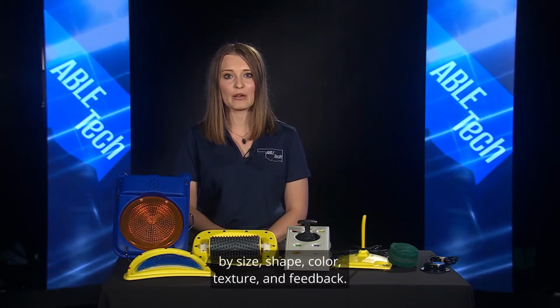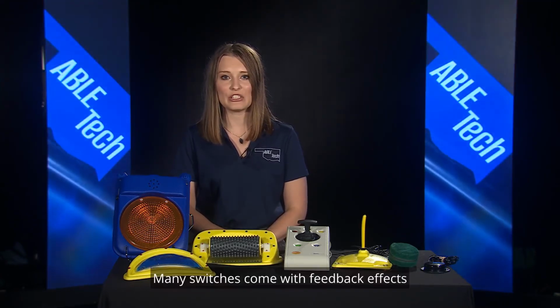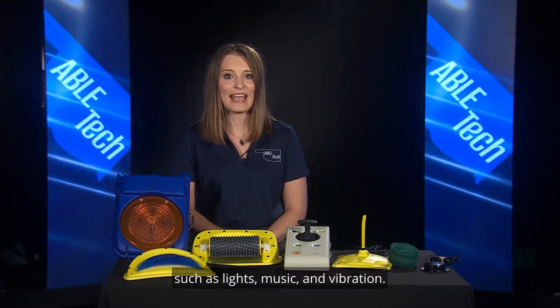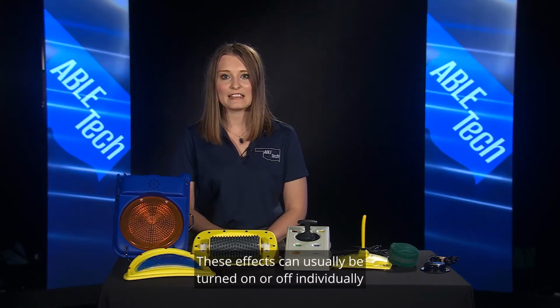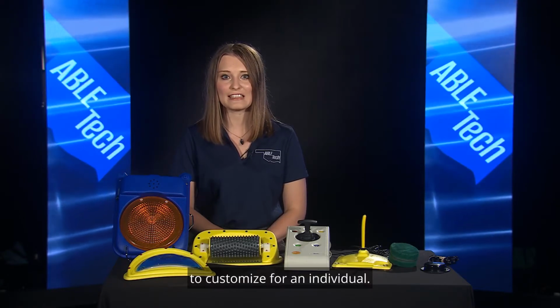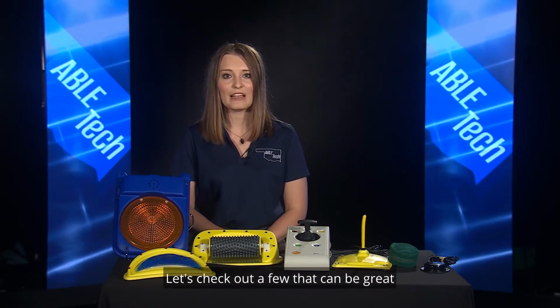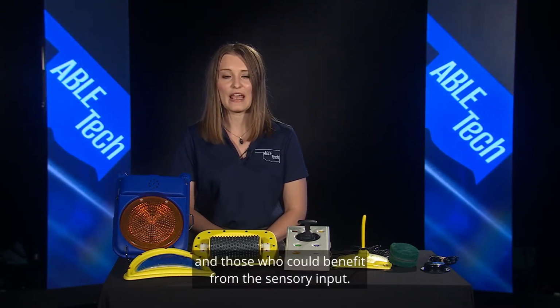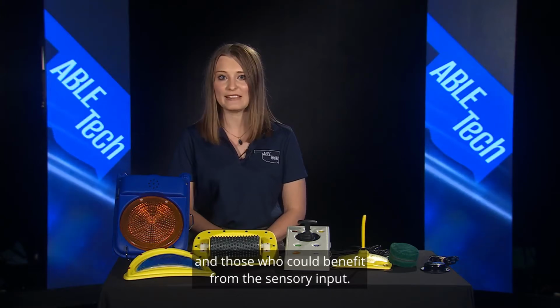Mechanical switches vary by size, shape, color, texture, and feedback. Many switches come with feedback effects, such as lights, music, and vibration. These effects can usually be turned on or off individually to customize for an individual. Let's check out a few that can be great for our beginning switch users and those who could benefit from the sensory input.